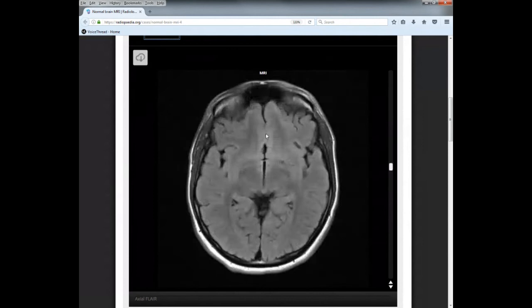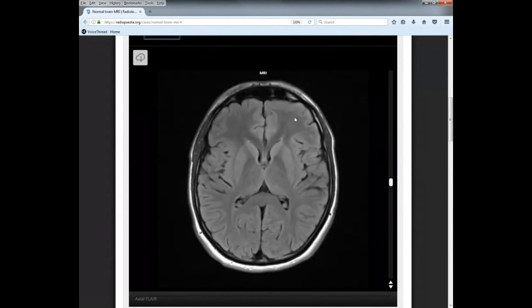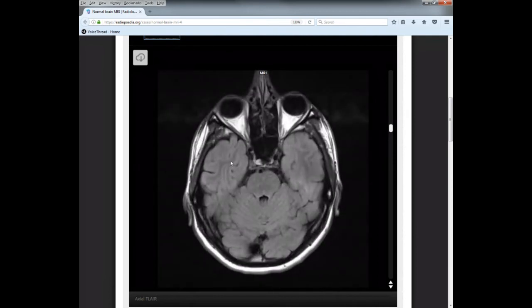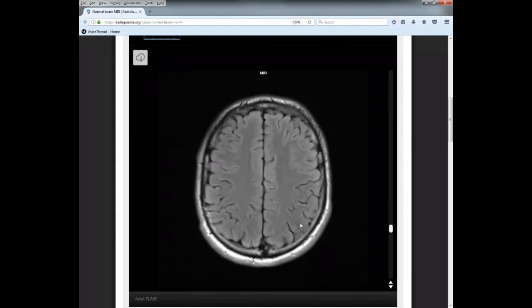So frontal lobe, most superior and anterior portion, right here. Okay, the most posterior and inferior is your occipital lobe, your occipital lobes. The most inferior lateral are your temporal lobes. All right, and then somewhere up here, the frontal lobe and the parietal lobes are separated. Okay, and this is where that kind of confusing thing where I talked about the mustache and watching the YouTube in the lecture, I'll show you exactly what he meant.